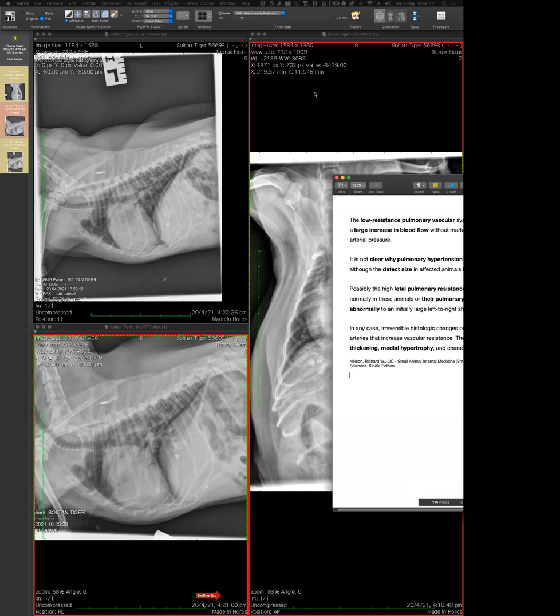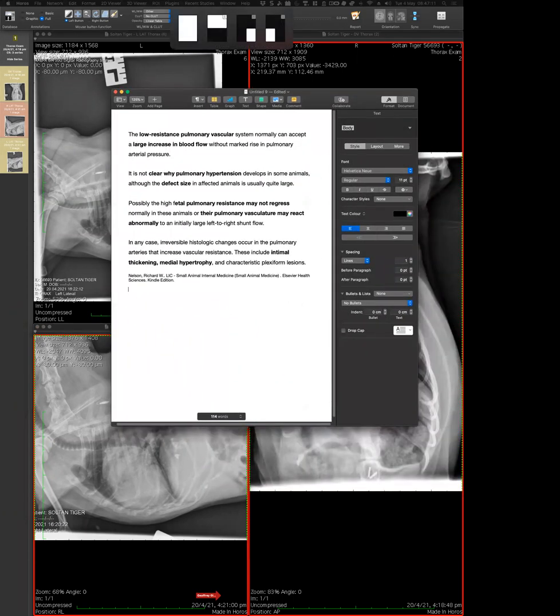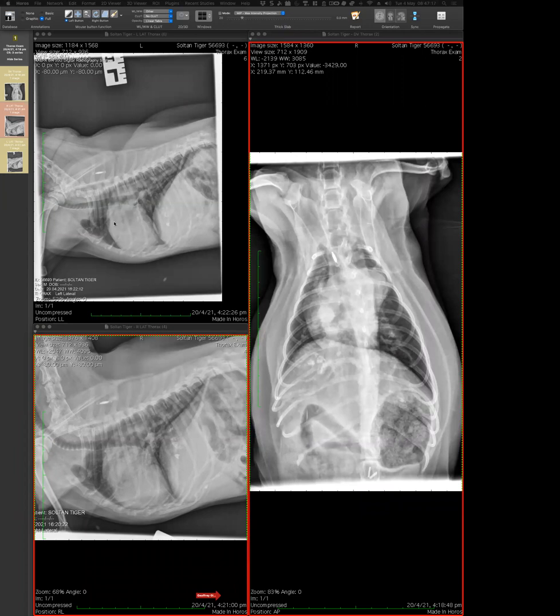Okay, and then suddenly deteriorate? Did it just suddenly reverse this shunt, or does this shunt look like it's been reversed for a long time? I think it has been for a long time, and I'm not sure what triggered these acute clinical signs. Could be unrelated. I think the thought was that the reason this dog decompensated was that it also had a really severe polycythemia secondary to the right to left shunt. So its PCV I think was 80 something, and it had hyperviscosity syndrome causing the dyspnea. Okay.